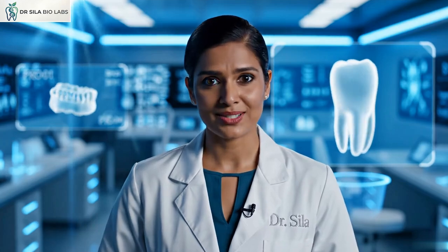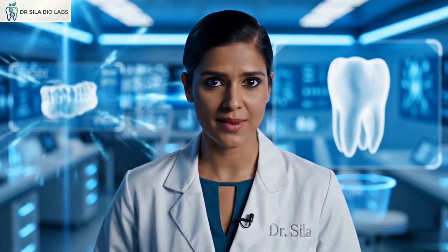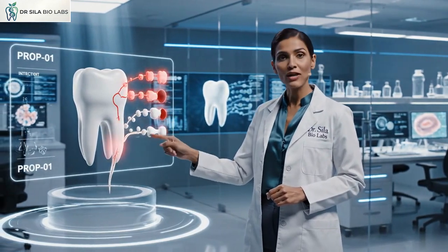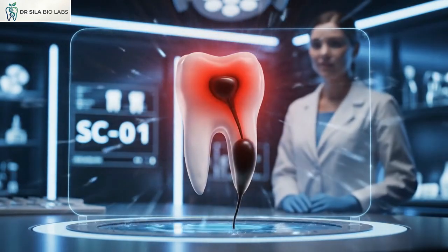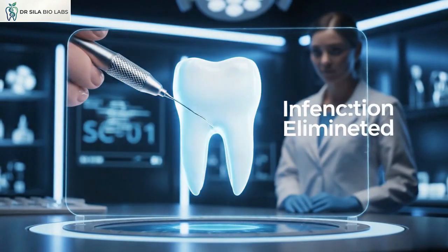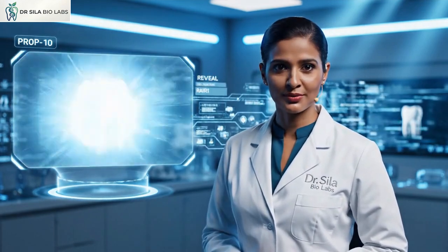In this video on dentistry, we will take an extraordinary journey inside a lower molar tooth using advanced medical animation. Together, we will explore how tooth decay develops, how infection spreads into the pulp, how an abscess forms around the root, and how modern root canal treatment can eliminate infection while preserving the natural tooth.